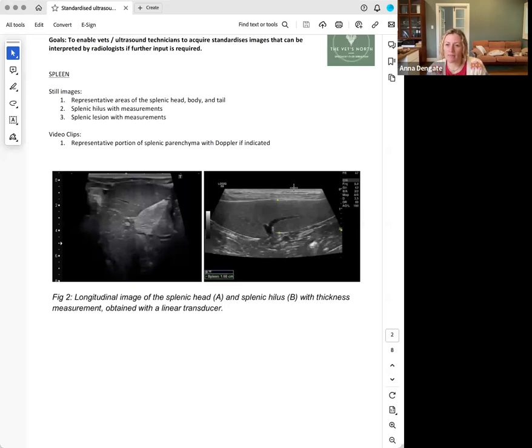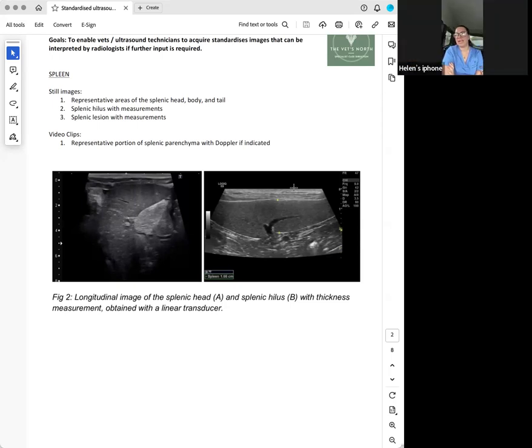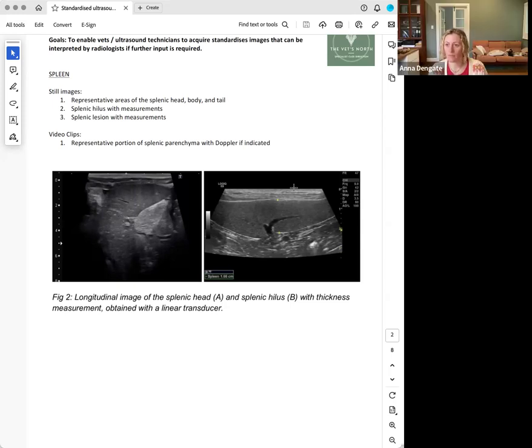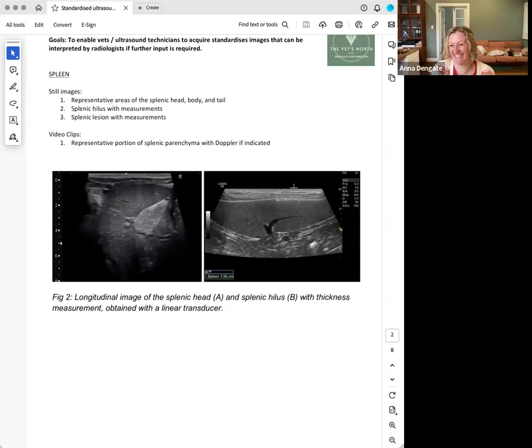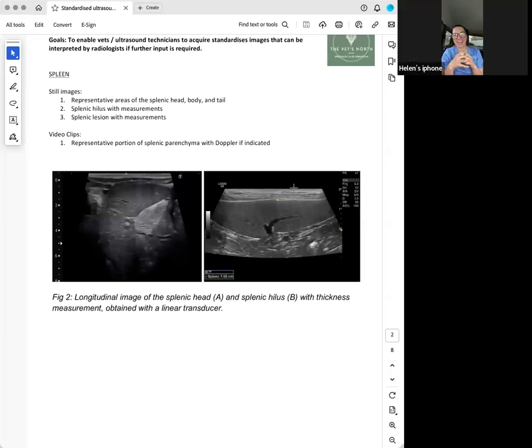What other things, like echogenicity, what else are we assessing in splenic nodules? If they're highly cavitated, like we discussed last night, you may not want to aspirate them, because you may just get a non-diagnostic sample if there's a lot of blood contamination, and cause a little bit of hemoabdomen while you're doing it. Versus if you've got a mass that's quite echodense that you feel like you'll get a cellular sample from.